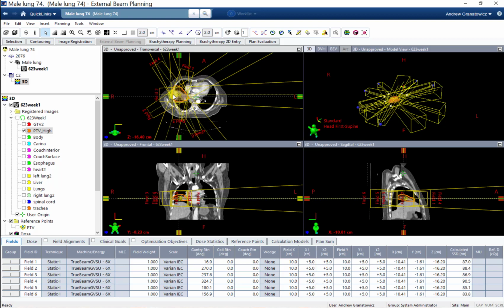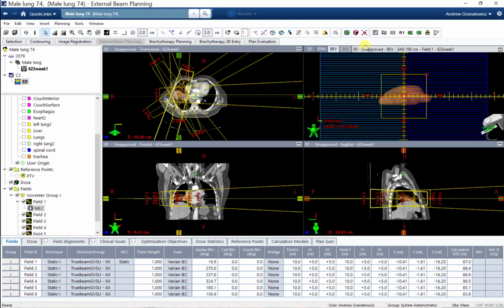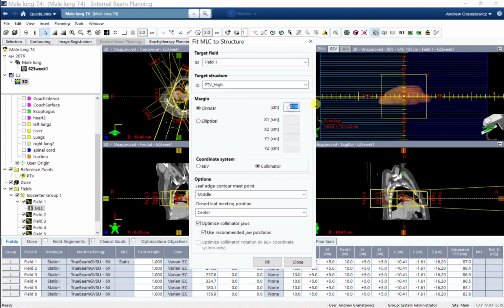For this comparison, just to make it simpler, we're going to leave it coplanar, but keep that in mind when you're doing static IMRT. Kicking the couch is a big benefit. Okay. All right, let's throw our blocks on. I'm going to start with just a standard 1/2 cm.